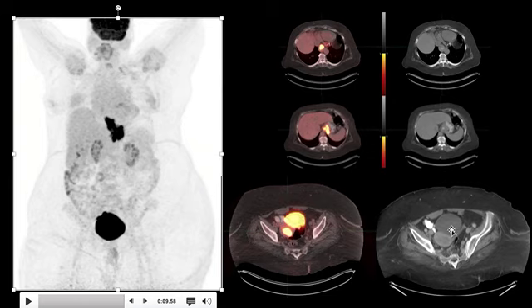This was further evaluated by a CT of the abdomen and pelvis, and it corresponds to mass-like thickening of the endometrium. Here's the uterus, and inside it is where we see intense hypermetabolism. This was biopsied and turned out to be an endometrial cancer of endometrioid variety. So always remember that when there is a focus of hypermetabolism which does not conform to the biology of the primary tumor, think of a second synchronous primary malignancy.